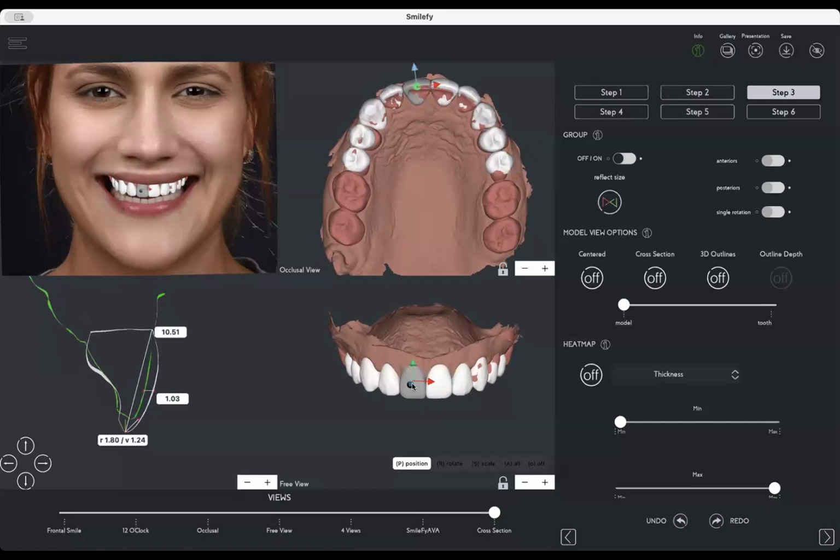Very important, we have in this view the cross-section. The cross-section as a quality control tool. We have the cross-section, and we have here 2 values. Real: 1.8 millimeters longer than the patient's tooth. Visual is 1.2. What is the difference between visual and real?